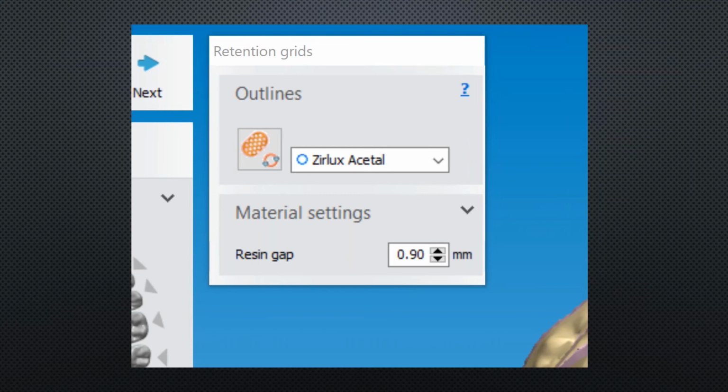That way we have more acrylic. Again, the more acrylic, the more gap we have under there, we're also going to have more of a butt joint. And we have acrylic, which is a rigid material, combining with a semi-flexible material. We don't want separation at that butt joint where staining can happen, anything like that. And so having a more robust butt joint, more materials kind of joining there, it's going to be rigid and solid and have less likelihood of any movement or separation and having any stain in that area. So the meshwork itself is going to be about 0.8 as well. So the thickness of the material on the mesh is going to be a little heavier than what it would normally set you up with metal. And the gap or the spacing underneath will be more.